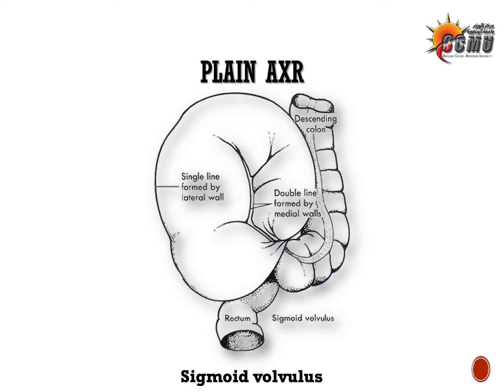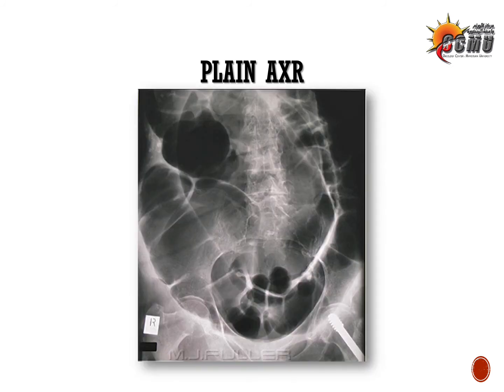Okay, let's get other views of large bowel obstruction with certain pathologies like volvulus. As you'll know, volvulus is rotation of the gut around its mesentery. Like in this film, it shows a shadow of a hugely dilated part of the bowel that extends in the right upper abdomen.